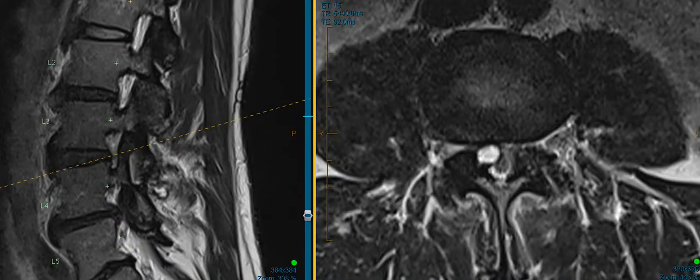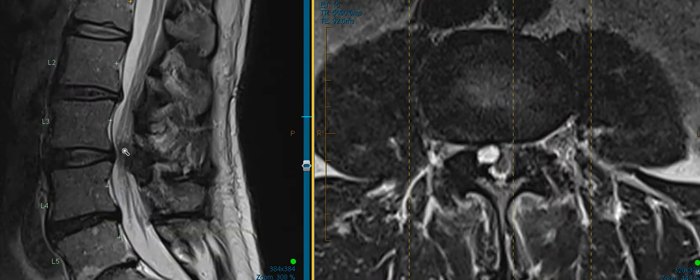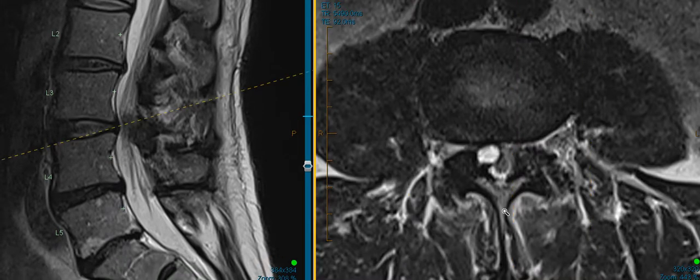We got an MRI scan of his spine. I'm going to show that to you right now and walk you through that a little bit. So this is the side profile of the spine on the left. You can see there's some sort of waistline or bottleneck going on right here. He's got a little bit of degeneration down in this lower area of the spine at the L5-S1 level, but something's going on here at L3-4.